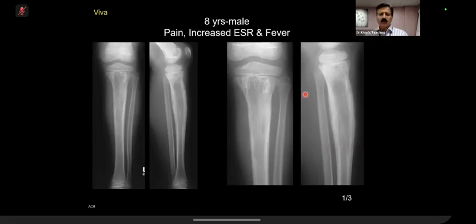I stop you here. So the take-home point is, I've shown you MRs in infections also. MR is the correct answer. You will ask for an MR because MR can at times differentiate between the two, infection versus a tumor. Please also remember that the main differential is infection versus Ewing's. Ewing's is the king tumor. In FRCR, always consider Ewing's up there, and it's very common also, relatively speaking.